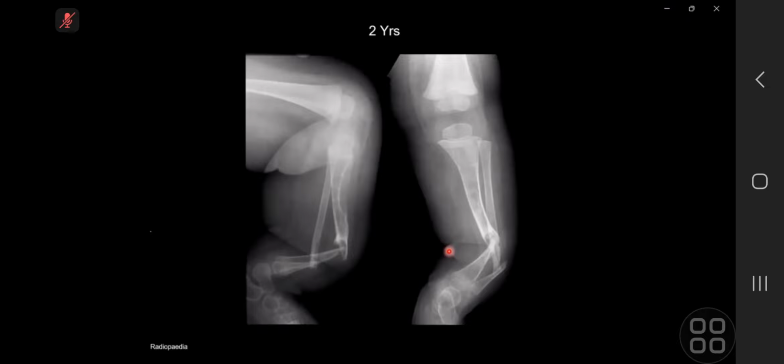This is a frontal and lateral photograph of an infant skeleton. There is gross abnormality seen of the distal tibia and fibula, which appears to have fractures with evidence of callus formation. There's also bowing of the distal tibia and fibula. These findings are most likely in keeping with osteogenesis imperfecta.